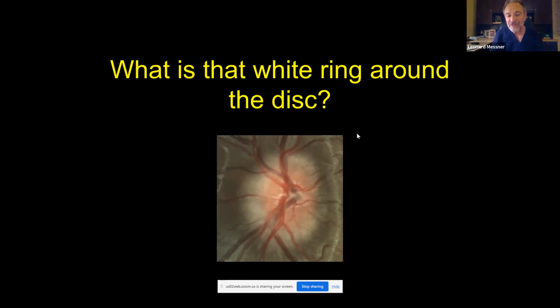So that's what I go looking for, particularly in younger individuals, because it takes a while for these things to evolve. Remember, kids aren't born with drusen. Drusen are an acquired phenomenon over time. And as the axons are breaking down, this is the axoplasmic material that's left behind.